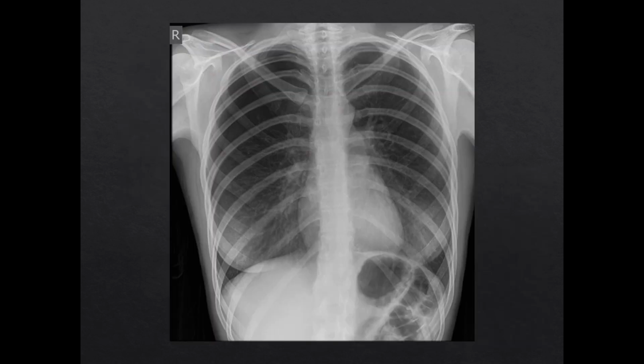This is a chest x-ray of a female patient with a pneumothorax. Initially, when you're first starting to look for these, they can be somewhat challenging to find. But when you know what to look for, and you've seen a couple of them, they not only become simpler, but they become fun to look out for. Just to orient ourselves, this is the cardiac silhouette, and we can see posterior ribs as well as anterior ribs. This is the left lung, and this is the right lung.